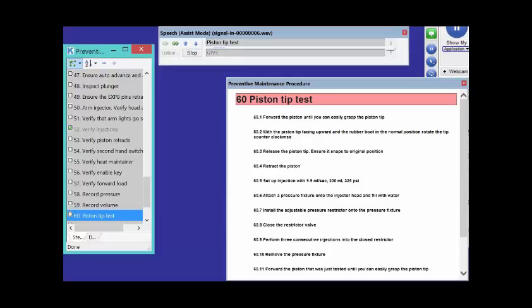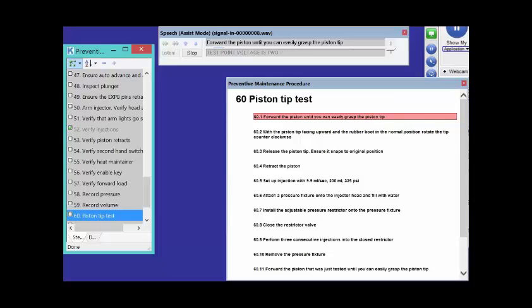Set average pressure delivered side B to 180. Pressure out of range. Measure test point 2. Pins 4 and 9. Test point voltage is 2.5 volts. Please replace servo CPU card. Set part number to 34579. Quantity. 2.